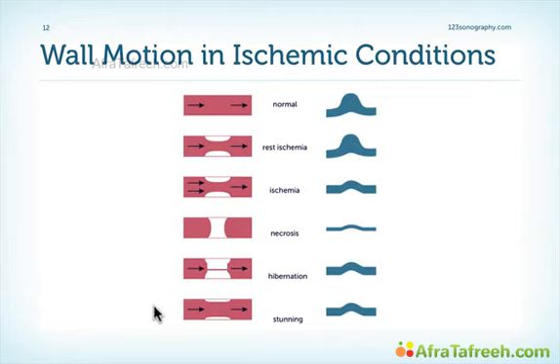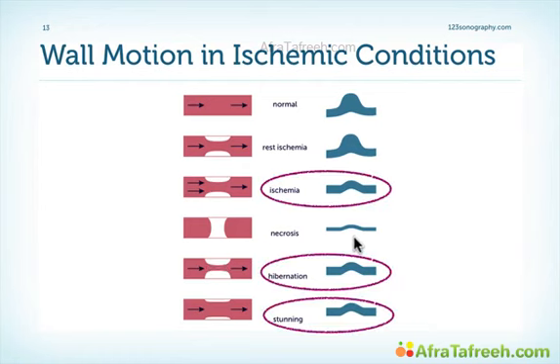And very similar, if the patient had an infarct and the vessel was reopened, there is stunning. We also have a normal thickness of the myocardium and hypokinesis. So if we look at the different segments with respect to their thickness and their contractility, we have ischemia, hibernation, and stunning, which show a very similar pattern.